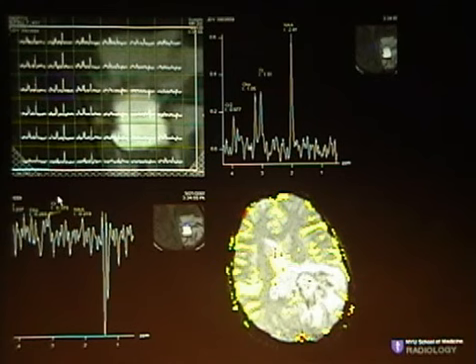So let's go back and ask the same question. Who thinks this is a tumor now? Okay, who thinks this is a non-tumor? All right, so I think it's clearly evident from the audience that when you look at spectroscopy, it's very important to look at the normal side and compare it with the abnormal side. And what we're learning more and more now is that if you have a decrease in overall metabolites, such as this, you end up with a non-tumoral entity.